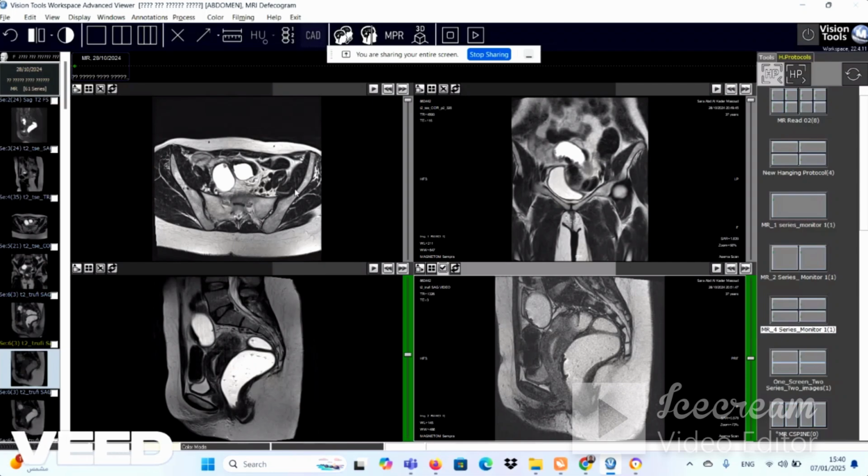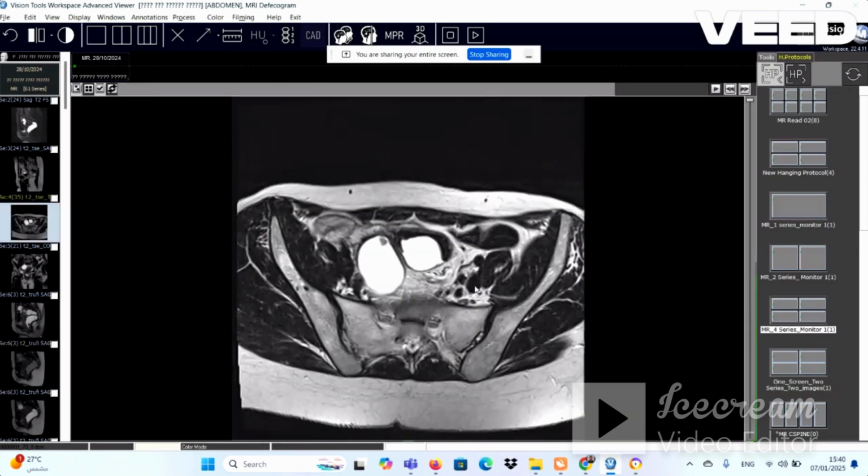Bismillahirrahmanirrahim. Today we will talk in our third part of MR Defecography, part 3 teaching session of ERA. As we discussed before, our technique for MR Defecography is divided between static image and dynamic image. And let us start with the static axial T2 image.